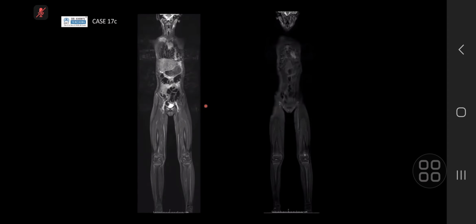Nowadays, with whole body MR, people use it to see if there are any other sites of asymptomatic disease, and often you're looking at the knees and ankles. It's one of those sites, and you're looking for metaphyseal involvement, but often they can cross the physes and involve the epiphysis as well, as in this case. So this was discussed in the bone tumor unit, and given the MR findings, this was more likely to be CRMO.